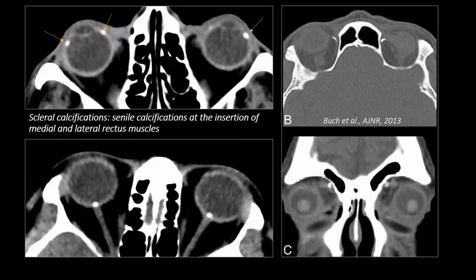And the patient on the left side, at the bottom, we see very small calcifications located at the level of the optic disc, and these are calcified drusen. They are foci of mineralized hyaline degeneration of the optic disc, very often an incidental finding in a patient who is asymptomatic. Well, that is to say, these are incidental findings and not a cause of symptomatology.